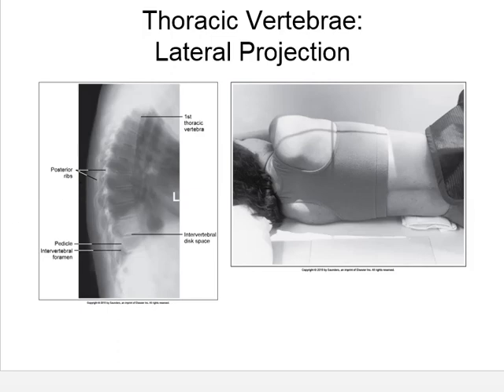We're going to evaluate the lateral T-spine similar to a lateral chest x-ray, only obviously on a lateral chest x-ray we don't want to see breathing or motion. On a lateral T-spine we're going to utilize the motion in the breathing to better visualize the vertebra.